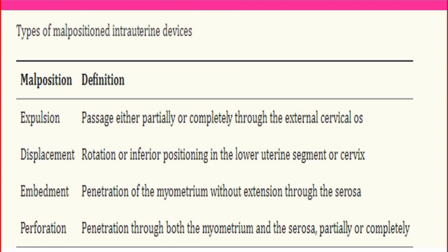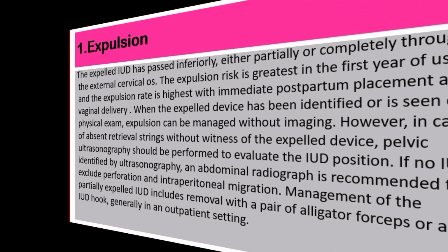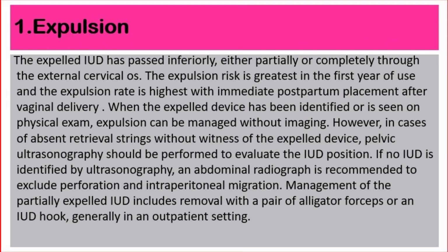Embedment means penetration of the myometrium without extension through the serosa. Perforation means penetration through both the myometrium and the serosa, partially or completely. I will explain each one in detail.